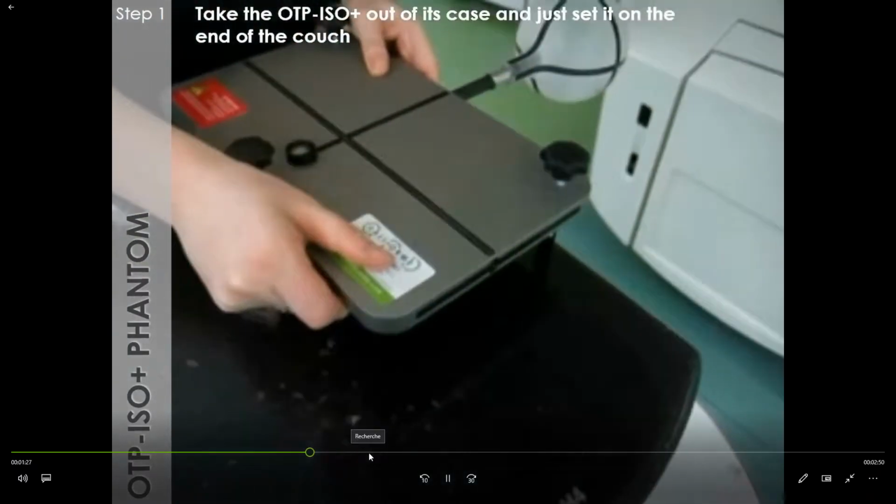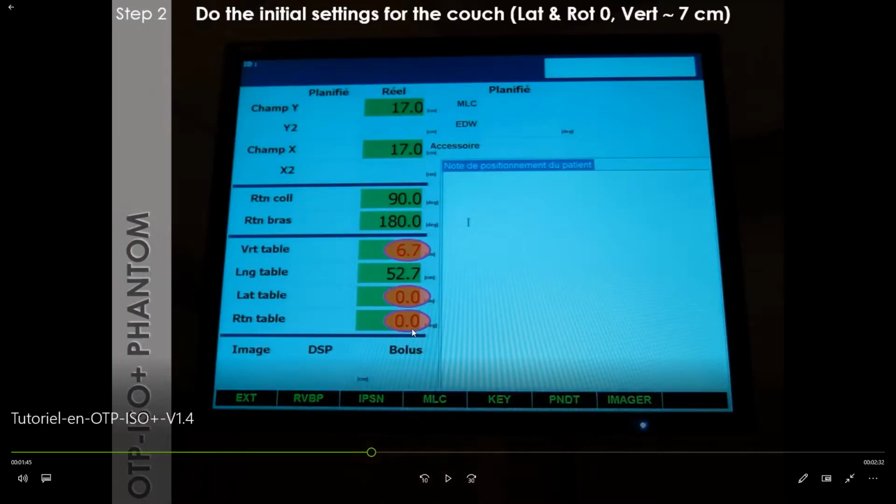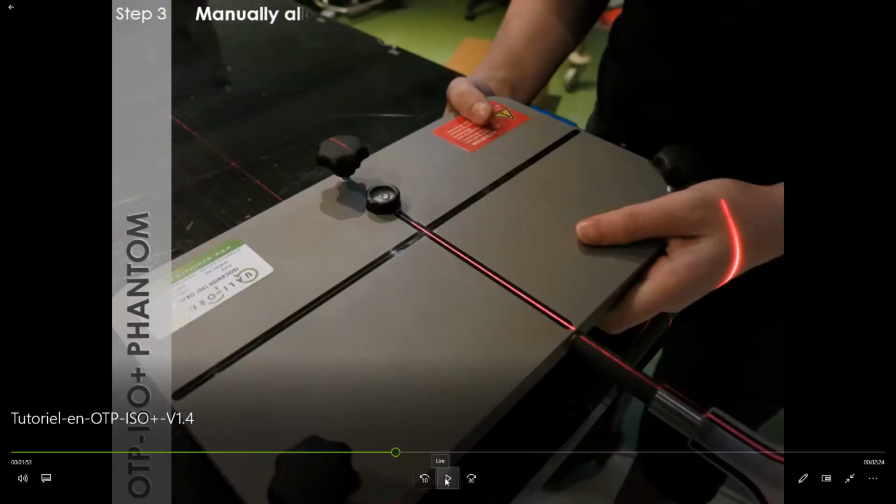First, you will adjust the couch for rotation at 0 degrees. Lateral couch at 0 with a couch height of around 7 centimeters. The following step is to align the plate, proceeding in the following order. Align the sagittal line of the plate along the sagittal laser. This is done by hand in order to gain time.